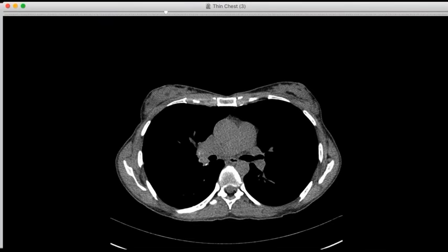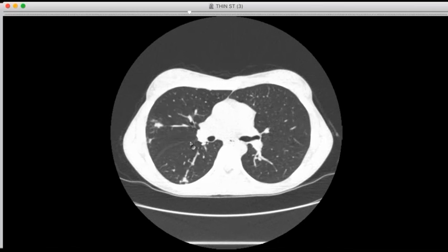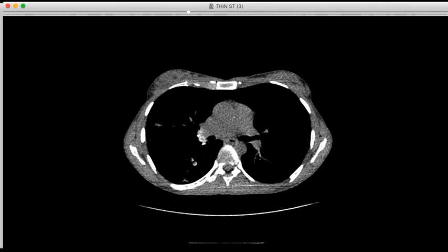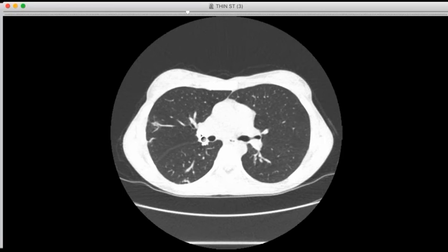And then the final scan I have is 2016 here. And so at this point, you see this nodule has become thoroughly calcified, as have the hilar lymph nodes. And there's denser peripheral calcification, there's some faint central calcification. And interestingly, in that area, what looked like an infarct is still sort of that irregularity there.